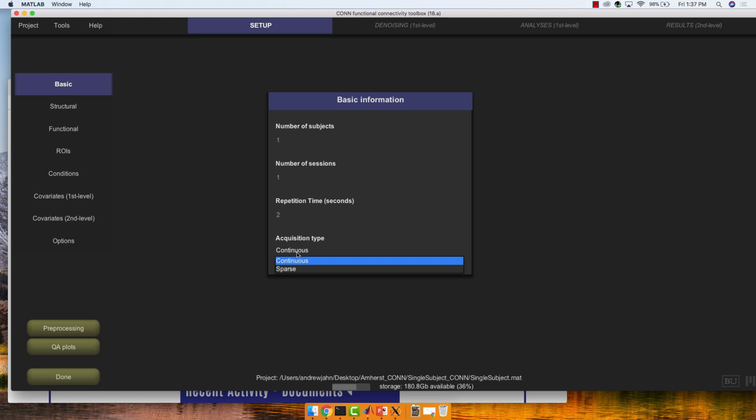Right. So basically, you're not hearing the noise, so it's not acquiring volumes, and then there's like a brief period where nothing is happening. So, what's that? I don't see choices. Mine just says continue. Oh, if you click on it, yeah. Oh, click on it. Yeah. Got it. But you'll probably just be using continuous for most of these.